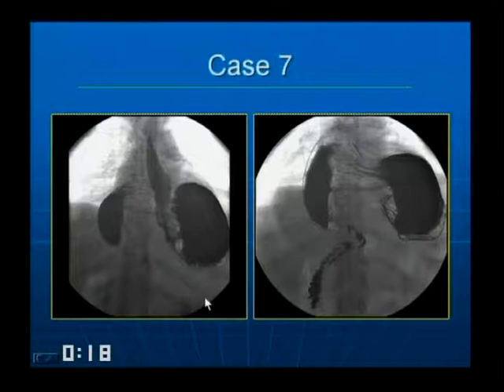Oh, my. Case 7. Okay, so what's going on? Volvulus. This is the most gorgeous case of volvulus given to me by my colleague at the University of Chicago, Aruna Vagytis. And you can see the stomach is totally flipped. And basically think about the axis of the stomach.